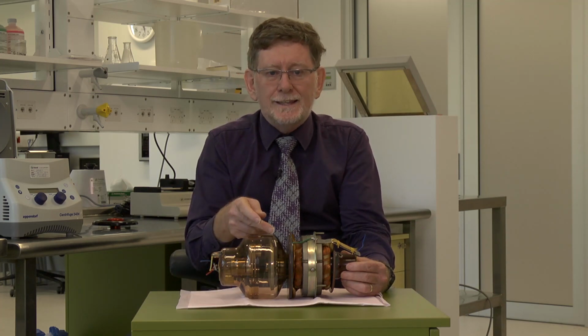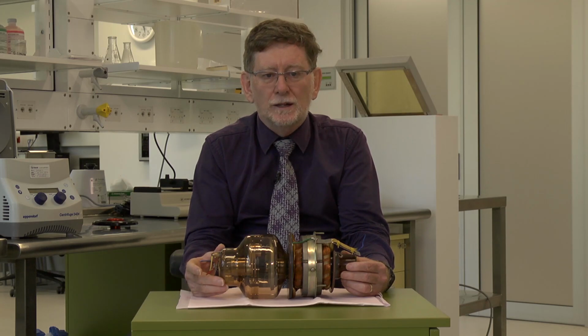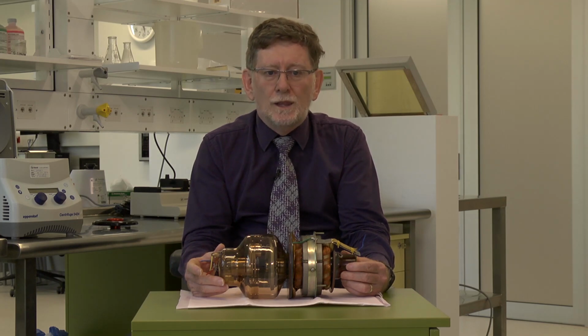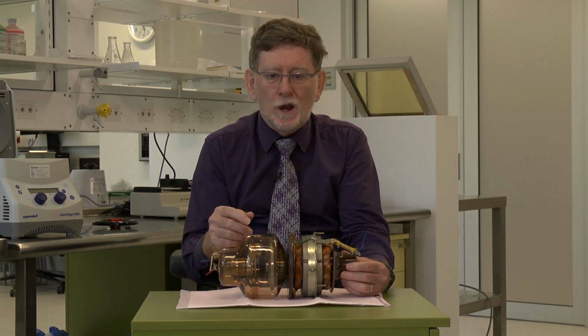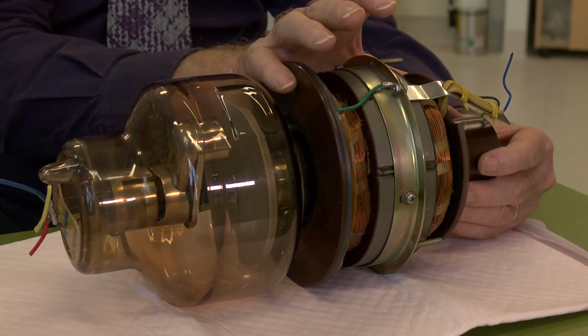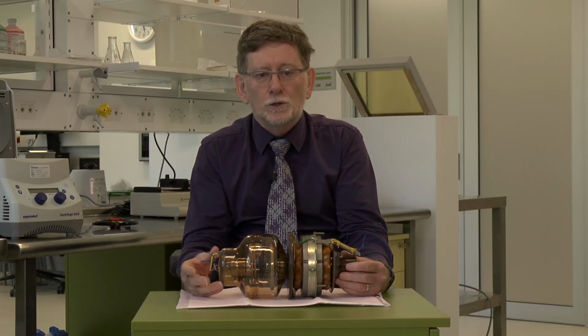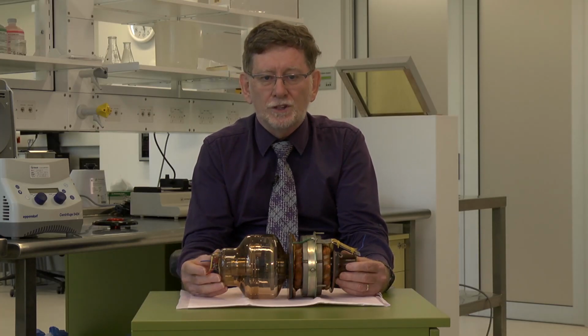When the electron hits the anode, it is decelerated as it collides with electrons in the metal. As it decelerates, it loses energy, which is released as an X-ray. The angle on the anode directs the X-ray beam towards this window. Here we have at this end the motor, which rotates the anode. Let us now go to a diagrammatic depiction of the rotating anode X-ray tube.